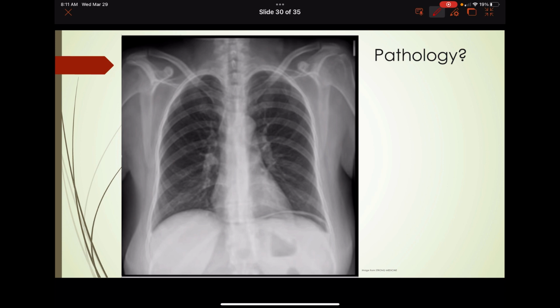And again, A for airway coming down, here's carina, trachea is clear. B for bones, bones look okay. C for cardiac silhouette. D for diaphragms. And this one here, you can see air under the diaphragm. This is a gastric bubble. This patient also has pneumoperitoneum. You can see some air over here too. Needs a general surgeon to fix him.